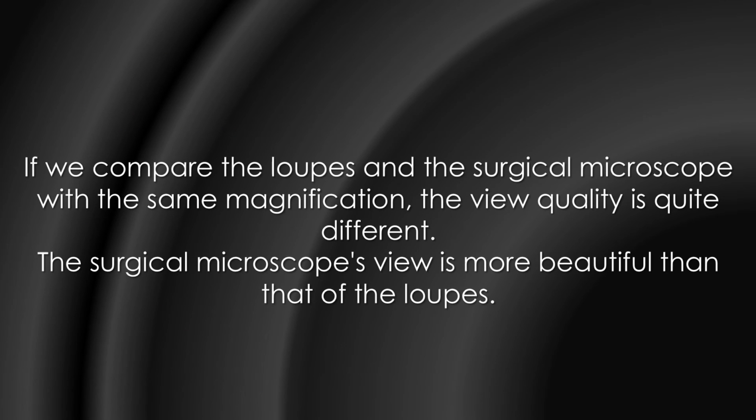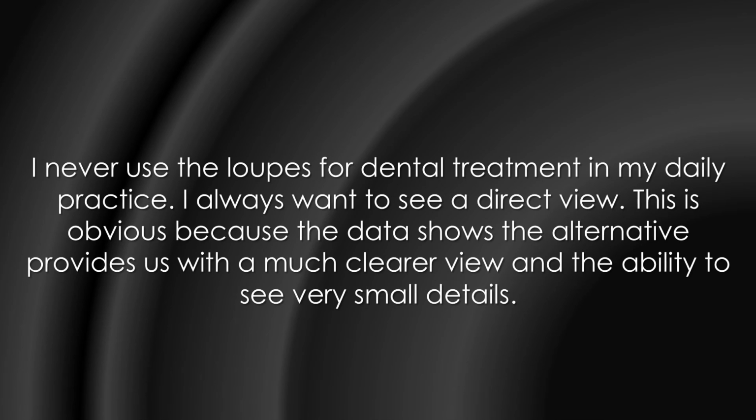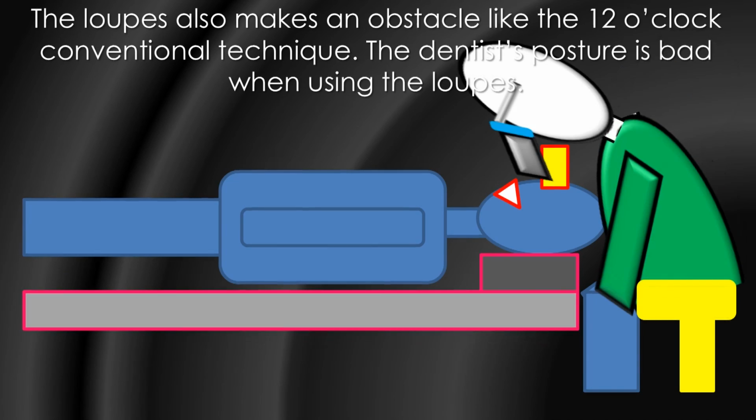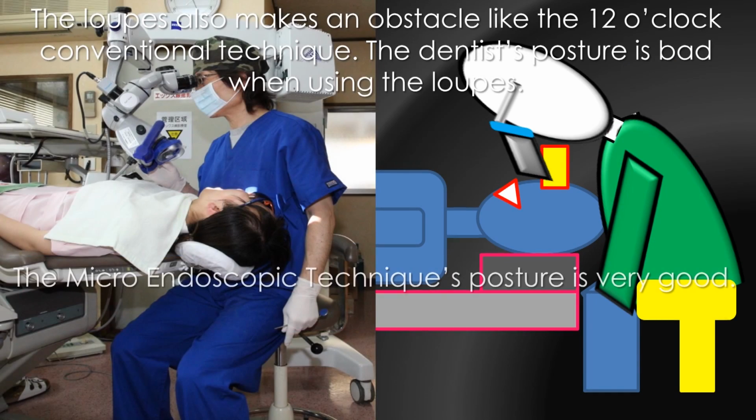If we compare the loupes and the surgical microscope with the same magnification, the view quality is quite different. The surgical microscope's view is more beautiful than that of the loupes. I never use the loupes for dental treatment in my daily practice. The loupes also make an obstacle like the 12 o'clock conventional technique. The dentist's posture is bad when using the loupes.